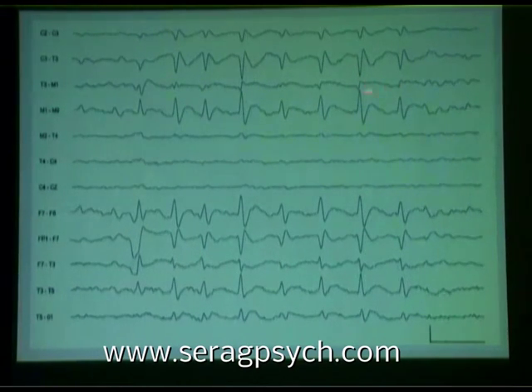Now notice another thing. Notice that if you do the coronal montage, going from CZ down through to the other CZ, you see the right side isn't involved at all here, but you see how much M1, the left mandibular notch, is involved here. And notice the little variability here. This is going down and this is going up. There's just a slight variability between that and that, and quite a bit of variability between this one, and then this one and that one, for example. Okay? So they're all temporal spikes, but they're not all the same.